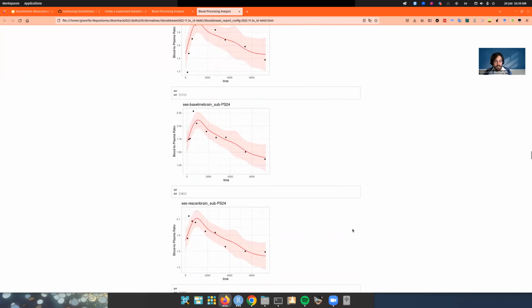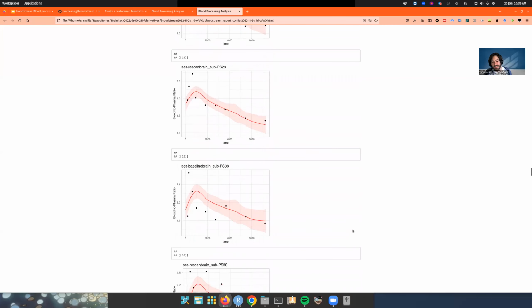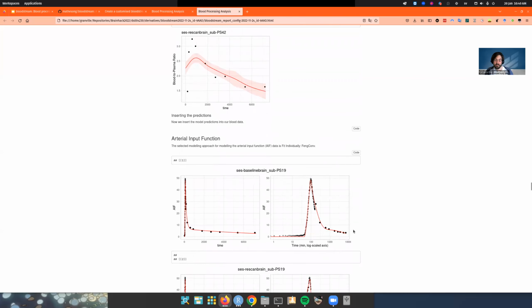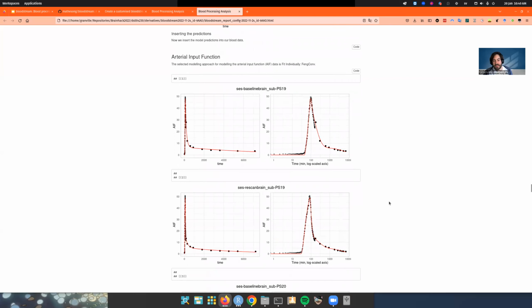And we can look at our fits, and they all look pretty okay. As I say, with blood to plasma ratio, my experience has never been that it makes a really enormous difference on things, but it certainly could. Blood modeling is something where you really need to be thinking about what you're modeling, and there are a lot of modeling decisions to be made effectively.